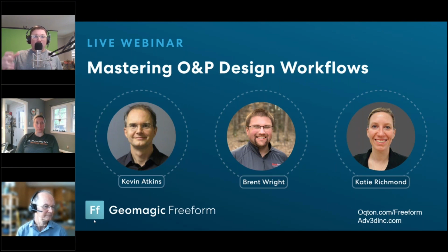We build off of the origin, and all of our defined parts come in on the origin. I think that's really important. Then we move all of our pieces to the origin. That is our foundation, and then all the organic stuff gets built on top of that, so we can make the automation work.